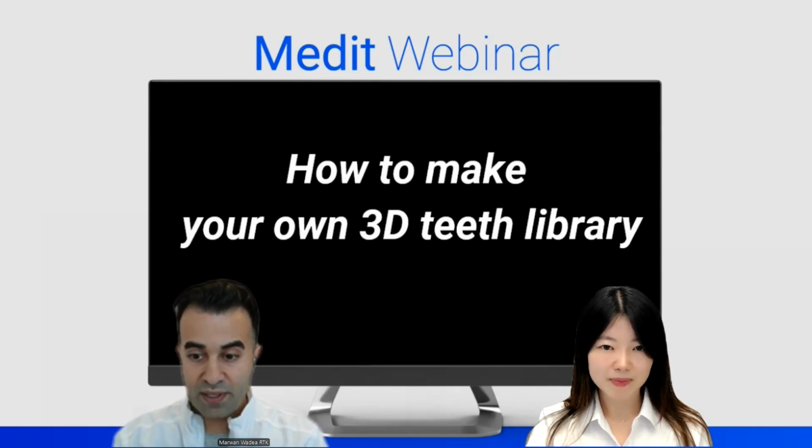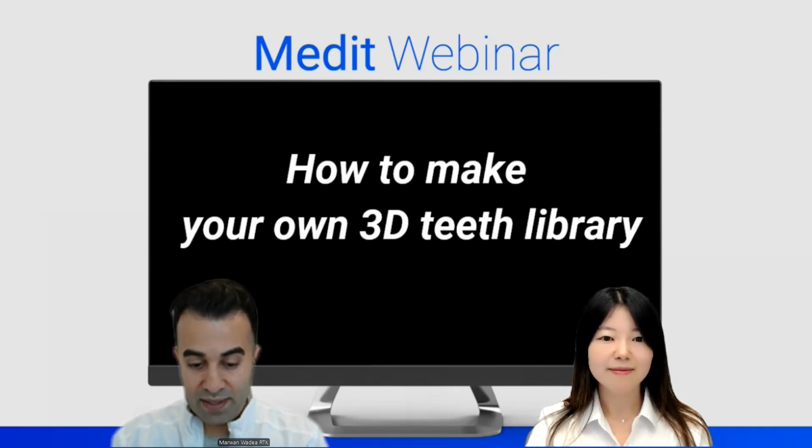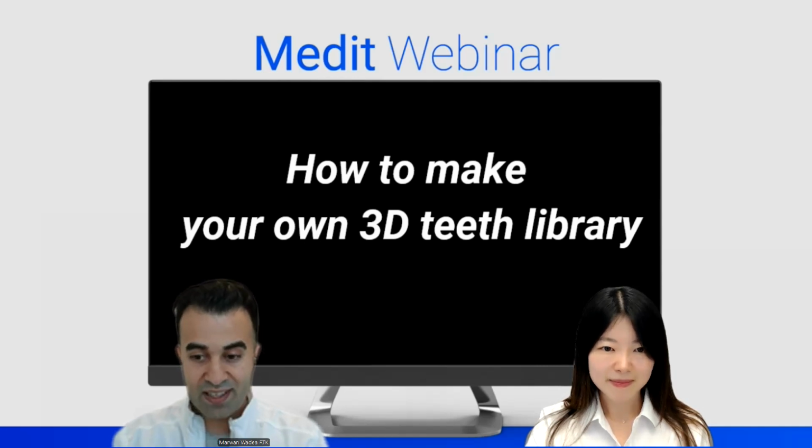In today's webinar, we're going to answer that question. We're going to show you step by step how to make a 3D teeth library of our own. And more interestingly, we're going to use the practice model that has been provided by the Medit company with our Medit scanners.